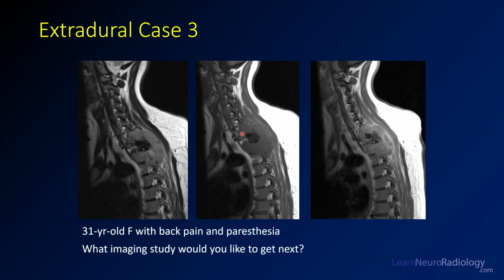You have some dark areas in the center where it's markedly hypointense. On your T1 pre-contrast, you see that this same lesion is isointense to the adjacent muscle and the marrow. Again, low intensity signal areas in between. When you give contrast, those low intensity T1 regions enhance pretty avidly. They enhance more than the adjacent muscle. So you have an enhancing mass. It looks like it's centered in the posterior elements of the cervicothoracic junction. Again, we're looking at maybe a bone lesion.